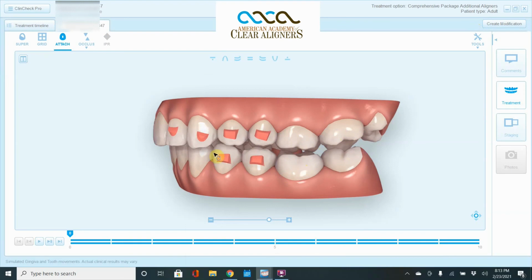I would suggest equilibrating. Maybe you can get something down. Or if you look in the American Academy Clear Aligner Journal from the winter edition, you could see a case where we saw elastics being used by Dr. Christina Blocker to close up the posterior occlusion here.